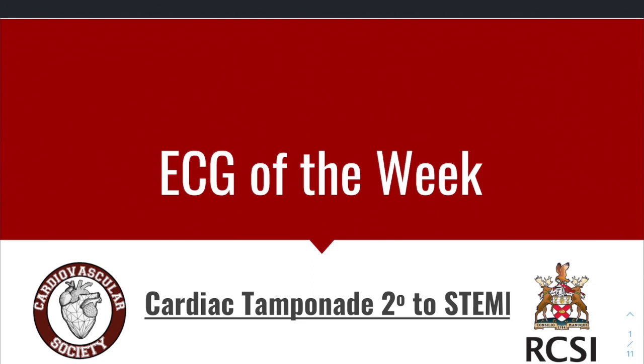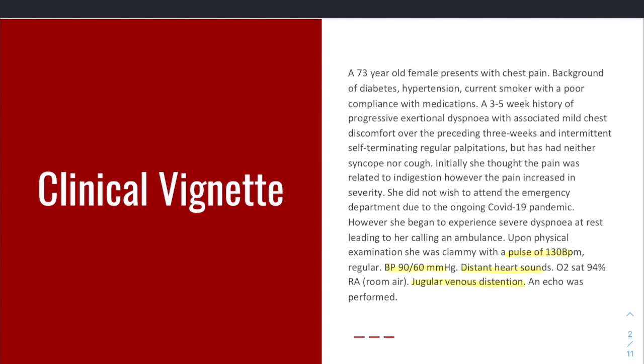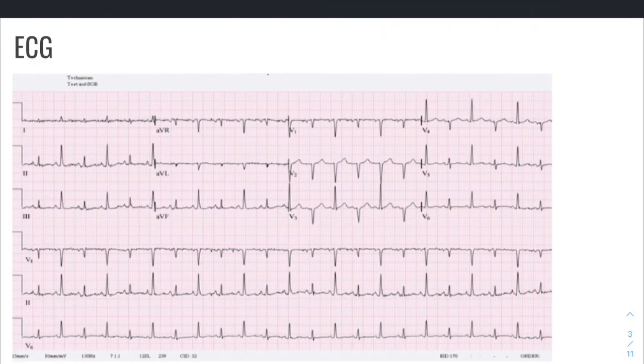Let's kick things off this week by taking another look at our clinical vignette and refamiliarizing ourselves with this week's case. And let's have a look at the ECG. So, you know what I'm going to say. Go to your 6-step method.